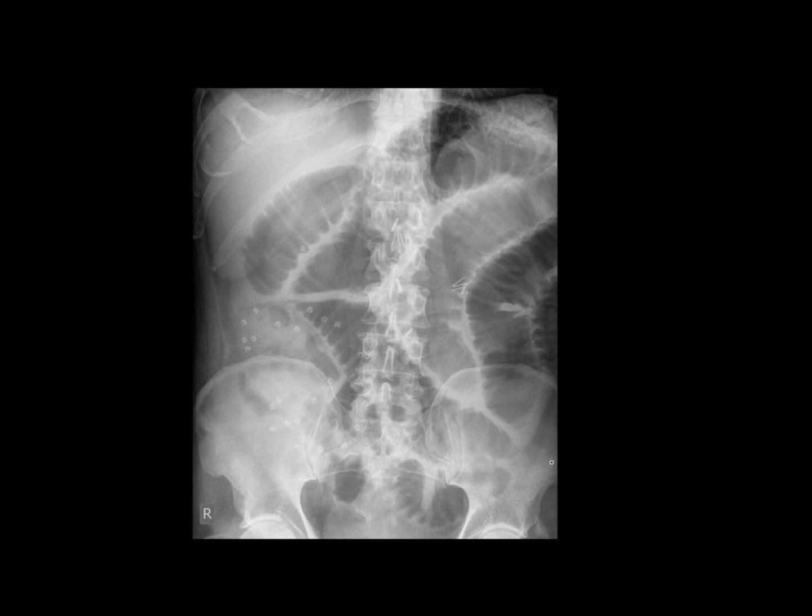Anybody can comment on this one? The abdominal X-ray shows dilated small bowel. That's a mesh, maybe hernia. I don't know. But here you can see the valvulae conniventes crossing the width, so it appears like a stack of coins. From this photo, you cannot identify the cause because you don't have the history. But it's small bowel, pure small bowel. Small bowel obstruction. Yeah.